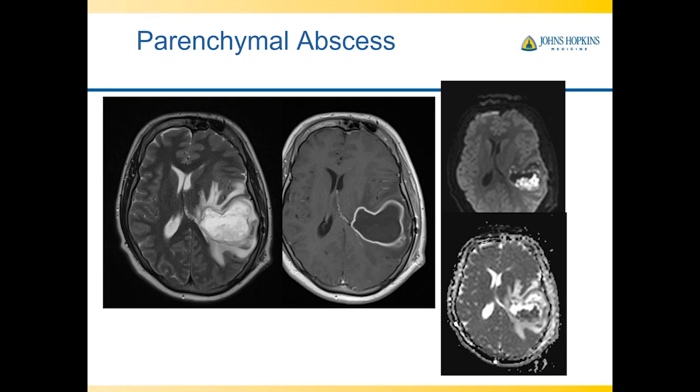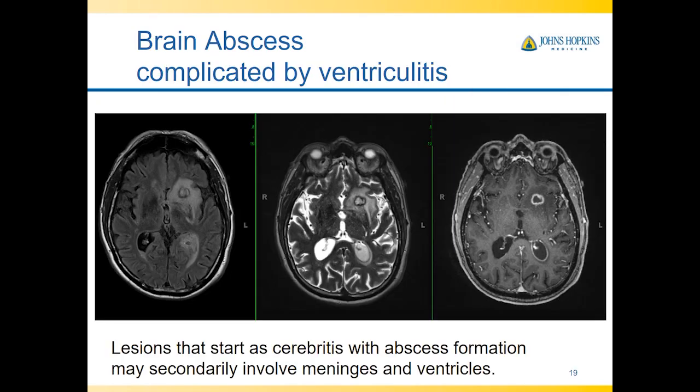This is an example of a patient who has a brain abscess which is complicated by ventriculitis. So the left frontal brain abscess probably entered the ventricular system through the frontal horn, which is not included on this particular set of images. However, you can see that there is rim enhancement along the left ventricular trigone with increased FLAIR signal in the contents of the left ventricular trigone. As you see on the axial FLAIR images in this region, there is a mild surrounding periependymal edema around the ventricular trigone, also around the abscess in the left frontal lobe.